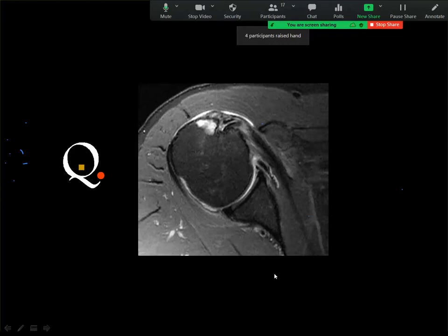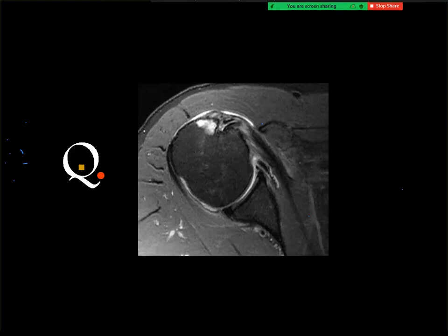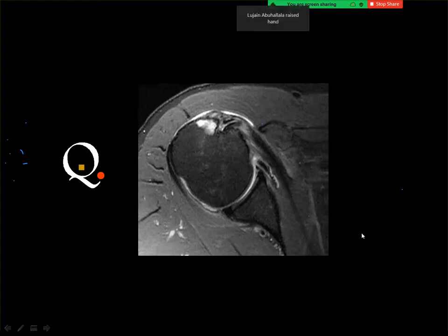What is the problem here? Subscapular ligament tear. Subscapular ligament? There is no ligament. Tendon. Subscapularis tendon, yes. And partial tear or complete tear? Infraspinatus is intact, and this is the subscapularis. What do you think? Is it a full thickness tear or a partial thickness tear? Partial. Partial thickness tear. What do you think of this structure?